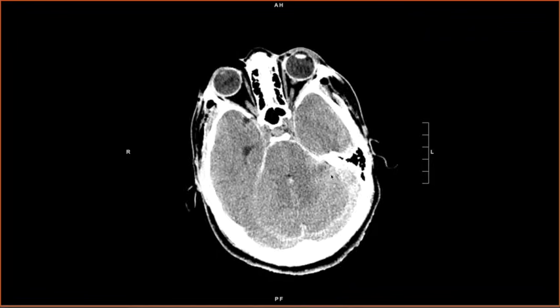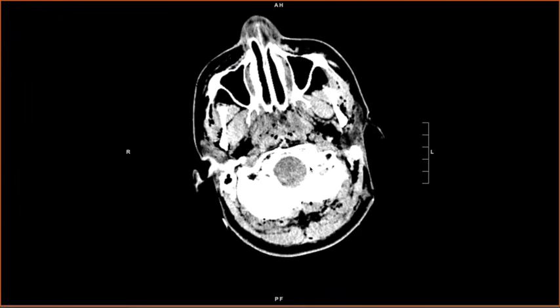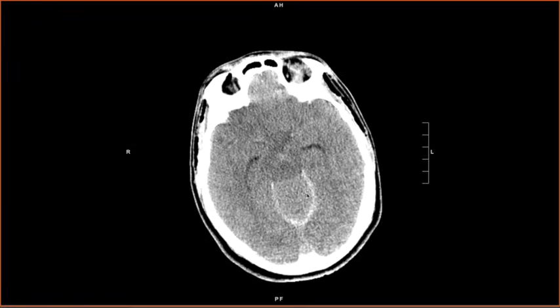As I scroll more inferiorly, still looking for mass effect, and there is fullness at the foramen magnum, suggesting tonsillar herniation. Okay, as a bonus point here, there's also ascending transtentorial herniation. The infratentorial brain is herniating superiorly through the tent and causing effacement of the quadrigeminal cistern here.